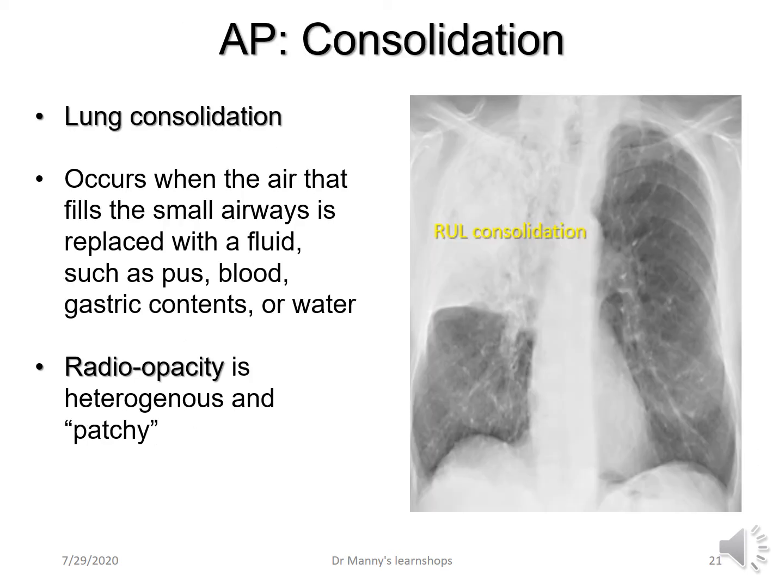Lung consolidation just means the lung is solid for some reason. There's stuff in there. It can't be moved. And this occurs when the air that fills the small airways is replaced with fluid, such as pus, a purulent fluid like pneumonia, blood, gastric contents because it's been inhaled, or water, drowning. So this is a radiopacity that's heterogeneous and patchy, but it does require further investigation.